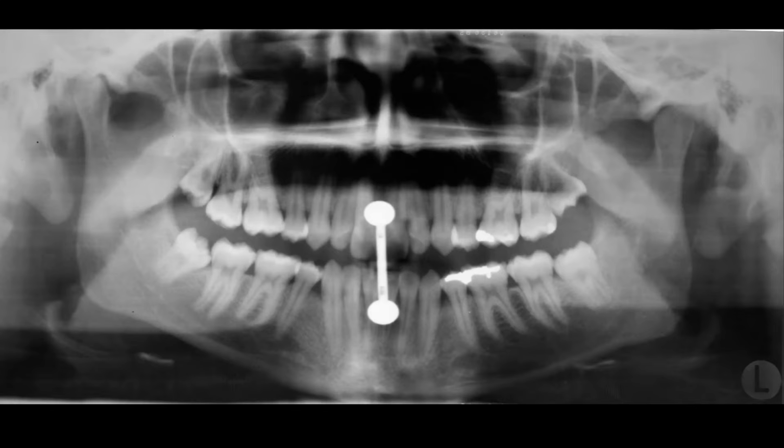This piercing is in the tongue and further away from the sensor. This is magnified, so it appears much larger than what is in the patient's mouth. With the piercing, several teeth in the anterior region are not properly recorded. Also, at the same time, see the tongue position error. The superior part of the maxilla is very dark and we cannot see the apices of all these teeth. So if there is a disease here, we have missed it completely. So this will be a non-diagnostic radiograph for maxillary anterior teeth.